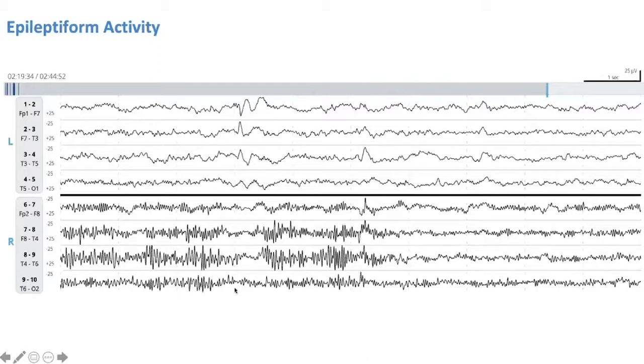This is actually artifact. Our eyes might go to that first because it looks rather nasty and fast and maybe angry, but this is benign. This is artifact from muscle contractions because the potentials from muscle are much faster than the potentials that we record from the brain at the scalp level. Of course, there are faster potentials if you record intracranially, but that's not what we're talking about here.